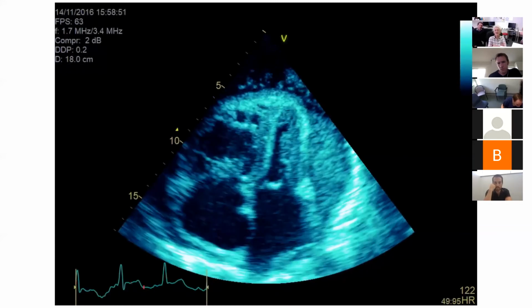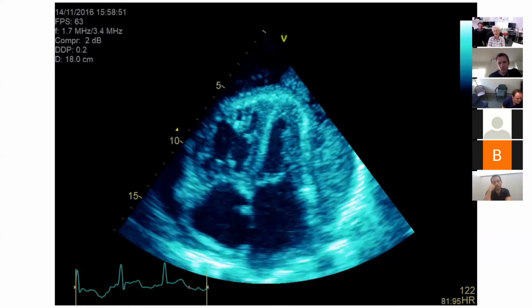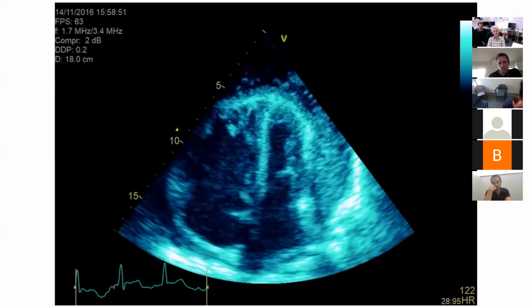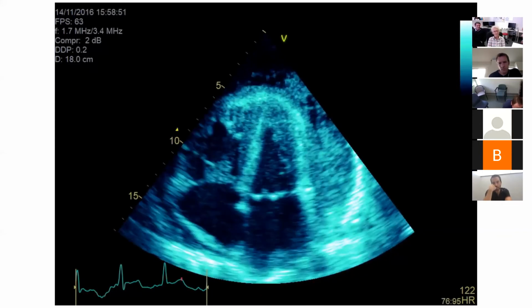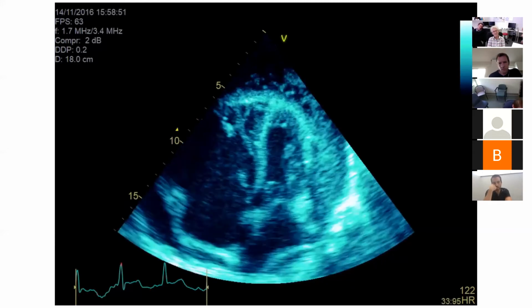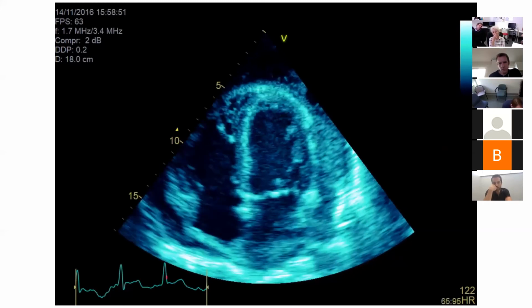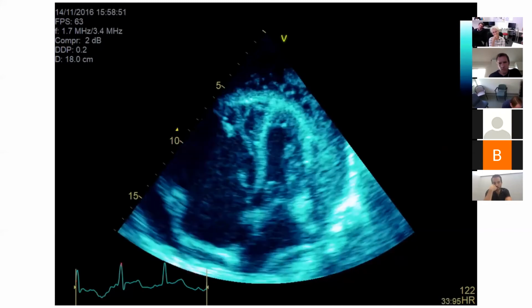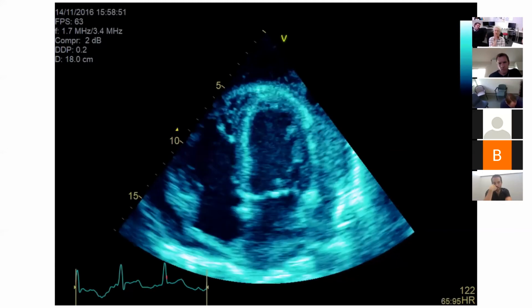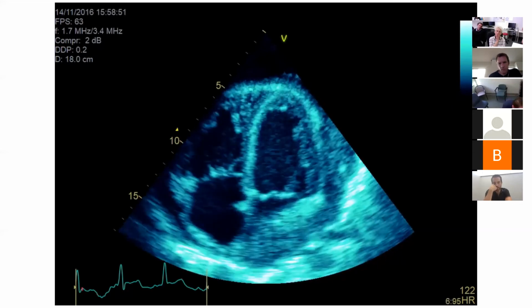Okay, so this is the 4-chamber view. Lee, tell us what you think about this one. I'll move on to other people later. Look, it also looks like there's maybe increased trabeculation on the right. The right makes up the apex with the left ventricle, which again suggests that the right ventricle is enlarged. The right atrium's huge. It looks like the interatrial septum's bowing into the left side. And again, at the apex and predominantly around the inferior surface of the heart, we can see a pericardial effusion.